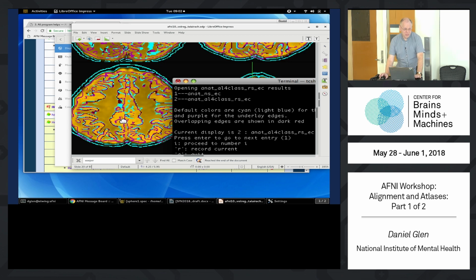Are there any questions? If you're going to use, say, affine transformations here, is that necessarily relevant? How are you going to? Well, these are affine transformations, so you're aligning between the EPI and anatomical with an affine transformation.